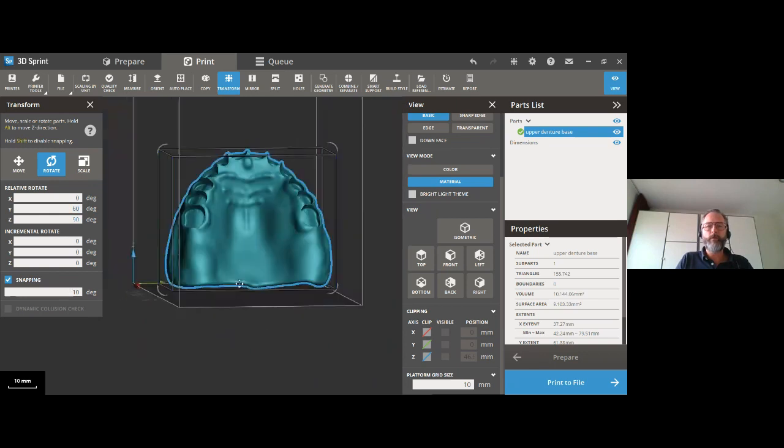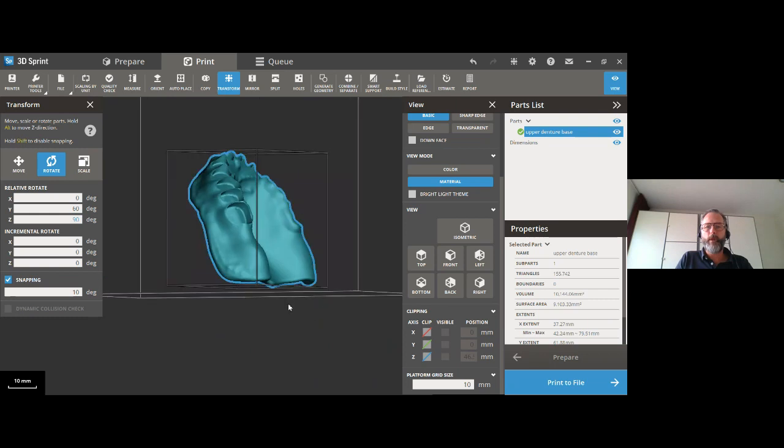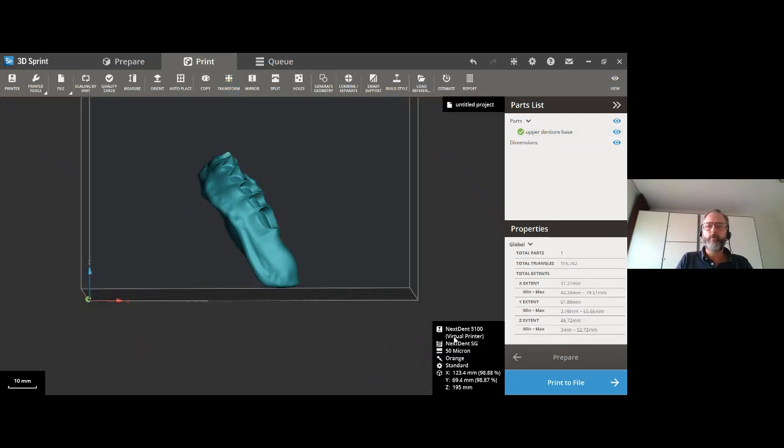So we print these upper dentures with what we in Holland call the A line or A zone, the end of the denture, to the platform in a 60-degree angle. Again, if you are printing something else, you must also select different build styles, etc.